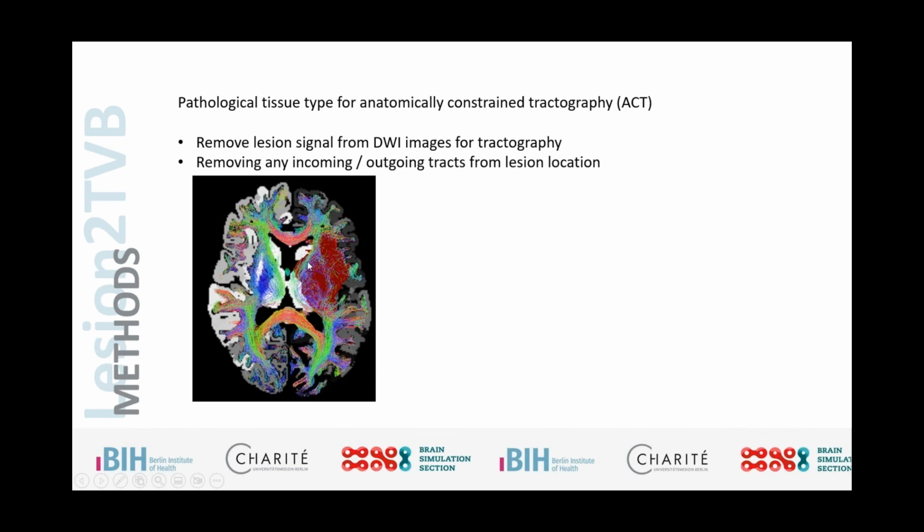So here, if we introduce the lesion mask as pathological tissue, as soon as the tract enters the mask, we stop. Pretty much having a lower threshold, all traces that start and end in this lesion are being disrupted and are no longer present in our connectome, which is what we see here. We're capturing everything that goes around. It's a little bit difficult to see this because it's a screenshot from a 3D image. So everything above the lesion we're still following, but nothing goes through the red mask of the lesion itself.